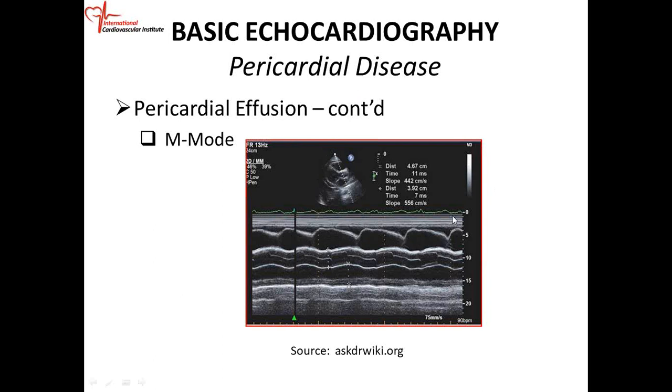There's an ECG on top, so you can use the ECG. If the ECG is not helpful because, for whatever reason, artifacts or it's not on properly, then you have to come up with other means of determining if this collapse is diastolic collapse.